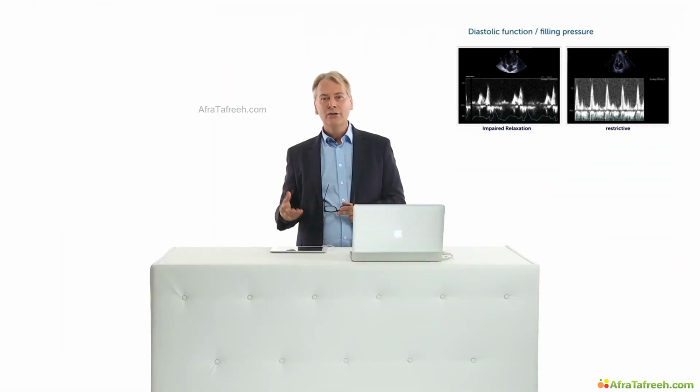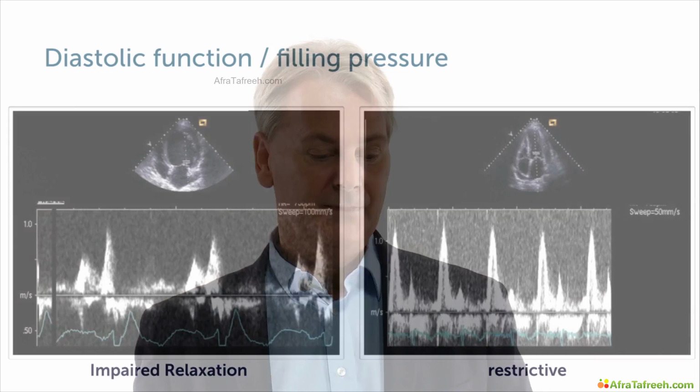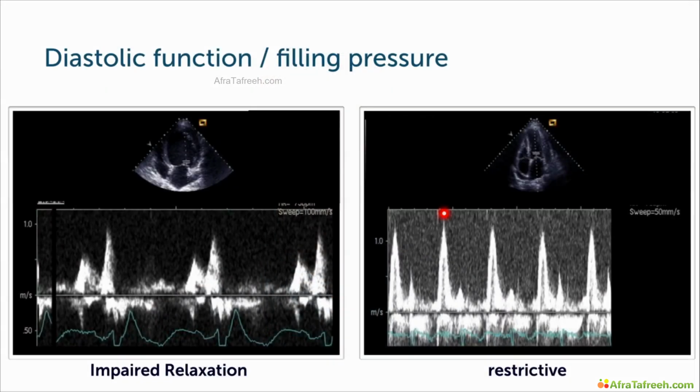Now, how do we use this in daily clinical practice? Well, I would use it in every patient. Even though it's, I would say, a crude way of looking at filling pressures, it does give you important information on the patient. If you don't have sinus rhythm, you can just look at the steepness of this curve at the deceleration time, and that will also correlate with filling pressures. If you want to find out more about diastolic function, we've got an entire chapter on this issue.